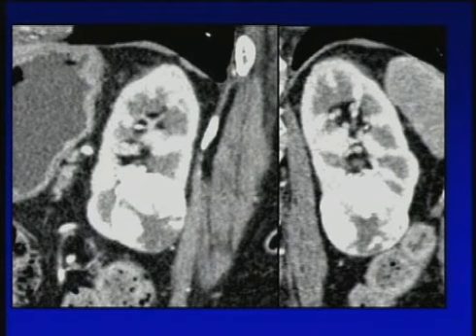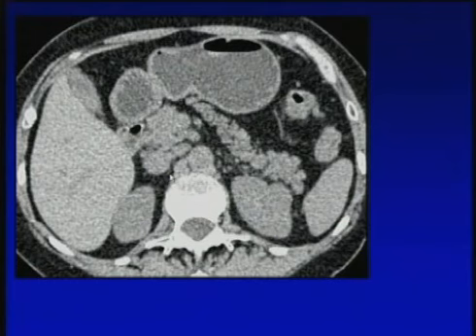This also is a good example maybe of a central scar with an oncocytoma. I'm about 100% accurate for diagnosing oncocytomas because I always diagnose them after the pathologist tells me that's what it is. Because reality is most oncocytomas and renal cells, you shuffle them. In most cases, they look pretty close.